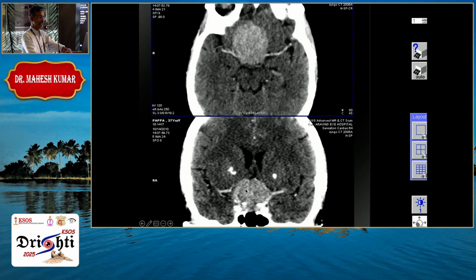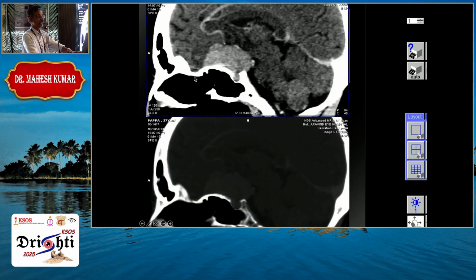Why is it not a pituitary tumor? Because the sellar fossa is not really enlarged and it is more suprasellar, slightly asymmetric to one side. And the radiologist showed that you can see it extending along the planum sphenoidale, and sometimes you can see what is called the dural tail sign, enhancing dura along the meninges.